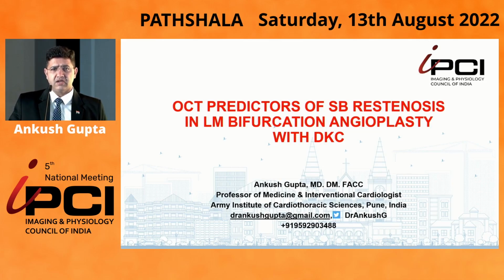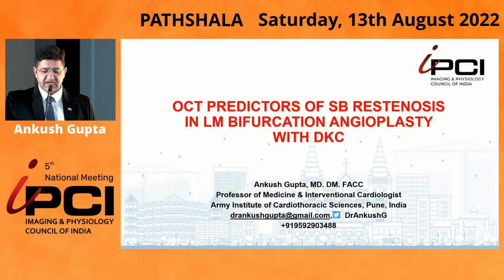In the next few minutes, I will be showing you one of our studies in which we tried to find out whether there are any OCT predictors of side branch restenosis in left main bifurcation angioplasty using DK crush technique. First, let me show you one case.